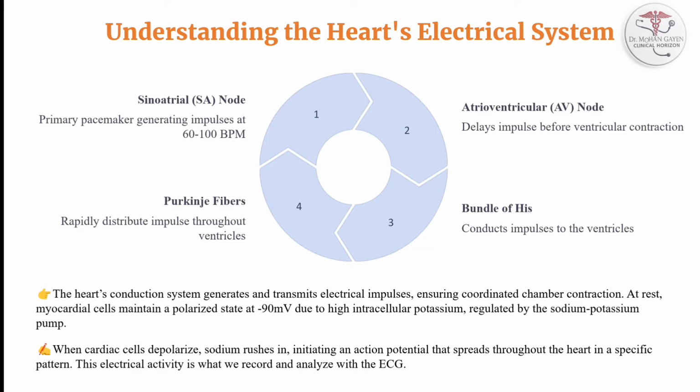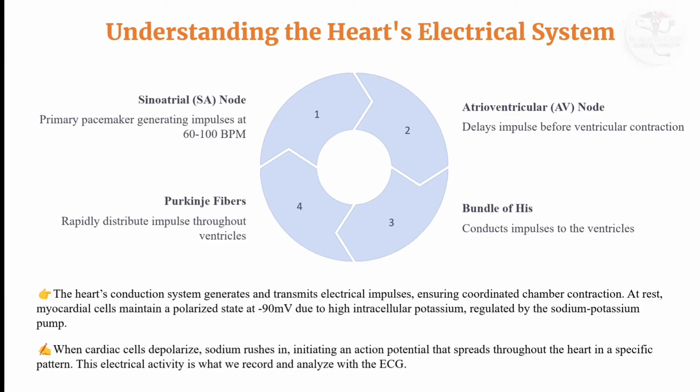The P wave corresponds to atrial depolarization. The QRS complex represents ventricular depolarization, and the T wave signifies ventricular repolarization. A deep understanding of these components allows clinicians to assess cardiac function and recognize abnormalities that may indicate disease.